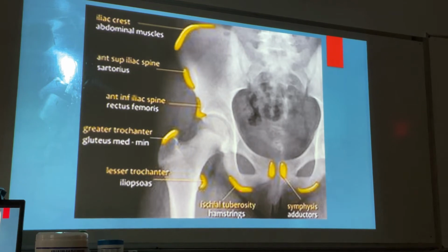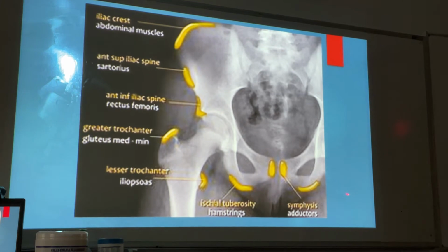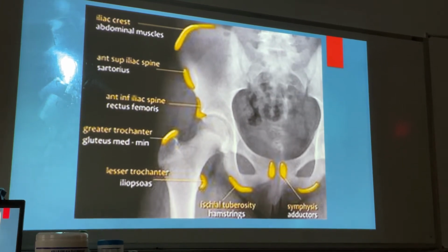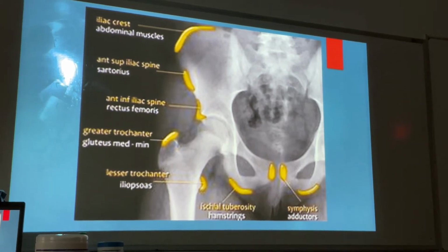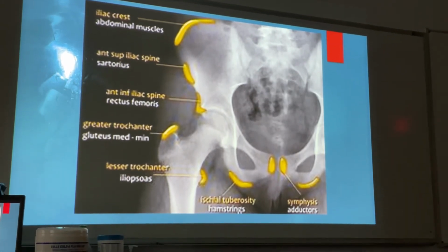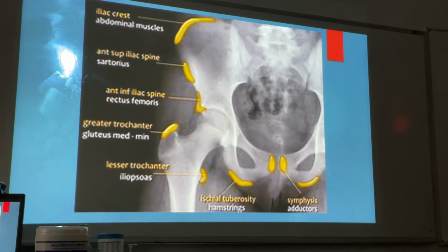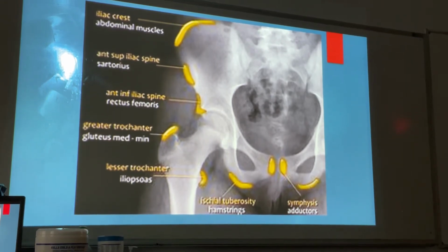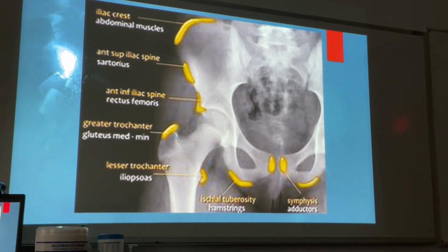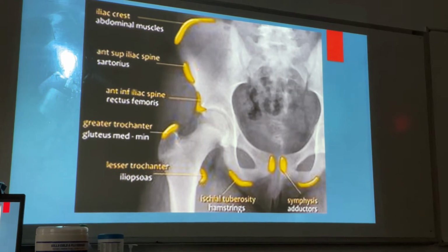So as we get older, our ischial tuberosities get really weird looking compared to an age-matched, sex-matched individual that's a couch potato. So if you're really, really active, you can get ischial tuberosity irregularity. That's just age-related change, but because you're an active weekend warrior, yours looks different than someone who just does nothing but watch TV. Do all of these avulsion sites become more unstable as we get older? Yes, because this area becomes less dense.